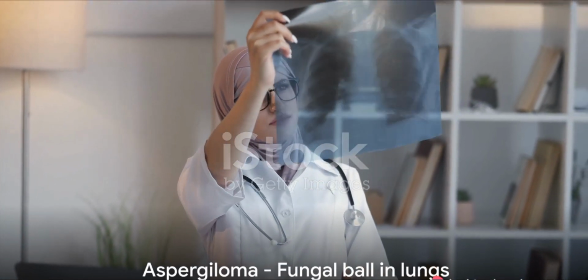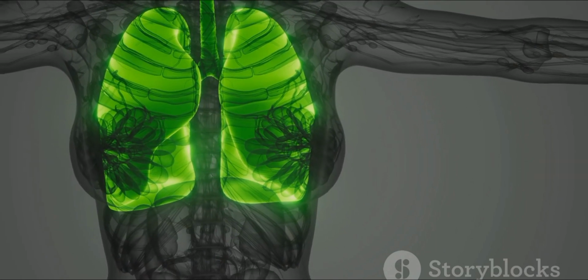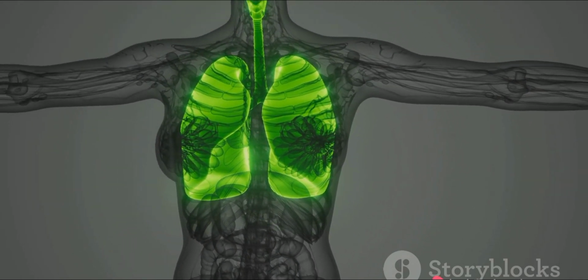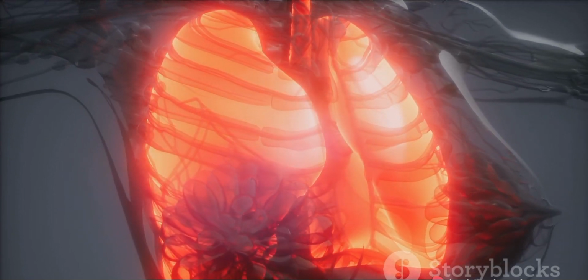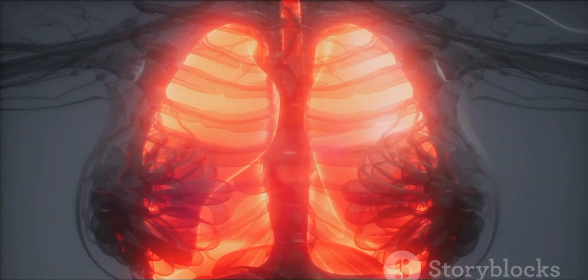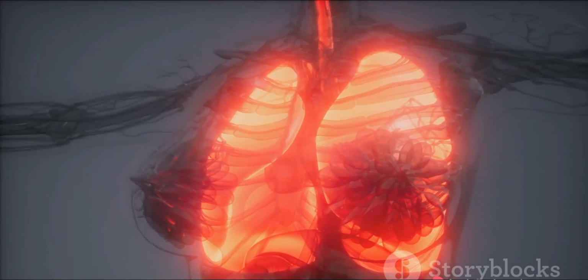First on our list is aspergilloma, a fungal ball in the lungs, often seen in patients with a history of lung diseases. This condition is associated with the air crescent sign. This term emerges from the characteristic radiological appearance. Picture a moon-shaped airspace that forms around the fungal ball. This airspace, or crescent, is created when the lung begins to heal around the infection. It's a sign of recovery, a hope in the darkness, if you will.